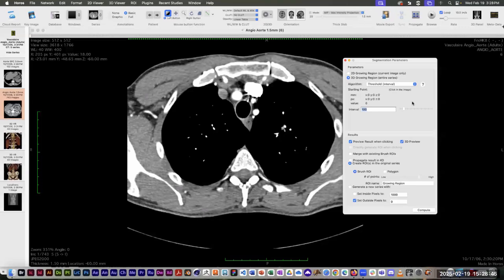So like I say, it works really well on the lungs because that's a couple of large solid structures that are black all the way through the entire series. I honestly haven't really tried it with a lot of other tissues to see how well it might work for something else.